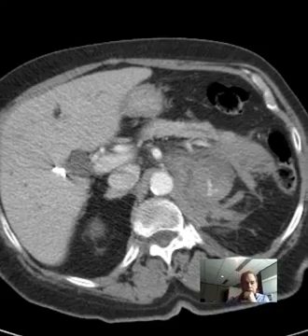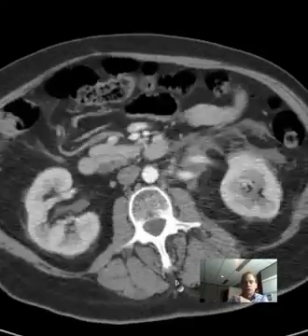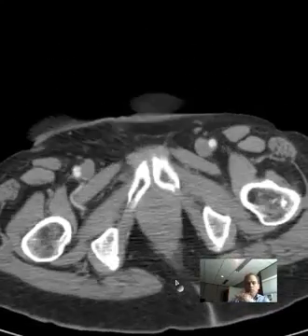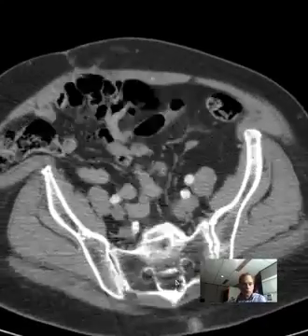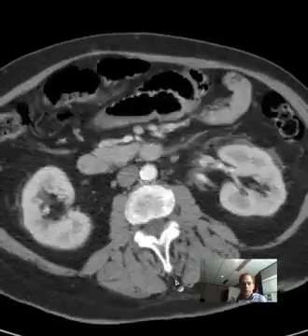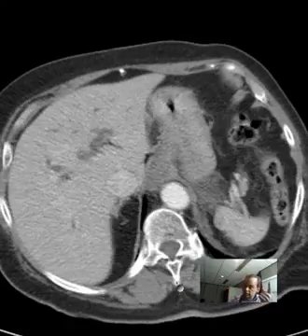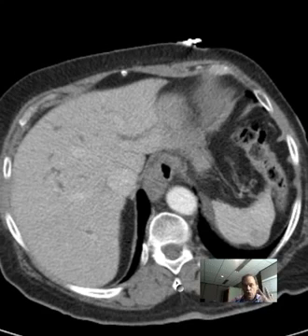Okay, now here we have a nice IV contrast enhanced study, CT abdomen and pelvis. Okay, there's your overview. So, three questions. One, is there an abnormality? Yes. Two, describe the anatomy including its anatomic relationships. And three, posit one or a couple possible diagnoses.